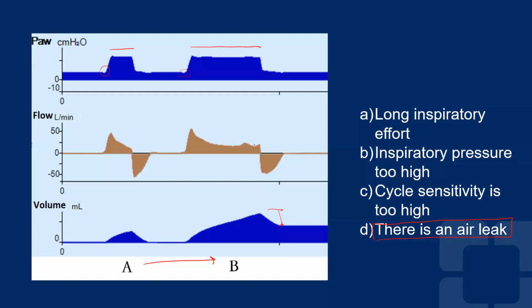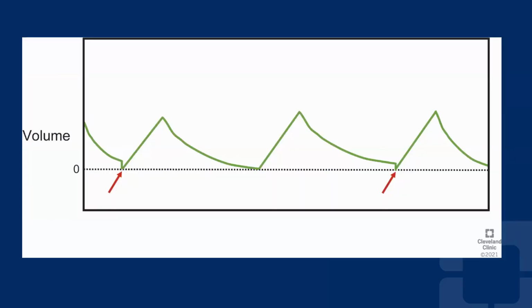All righty. So this waveform is from another, different ventilator. Again, on the top is pressure, in the middle is the flow, and on the bottom is the volume. And here the question is, what pattern are we seeing here? When the patient triggers a breath, this ventilator puts this marker here, this little triangle in pink, that tells you that the ventilator is sensing that this breath was triggered by the patient. And then you look at the flow, and this is, again, a pressure controlled breath.